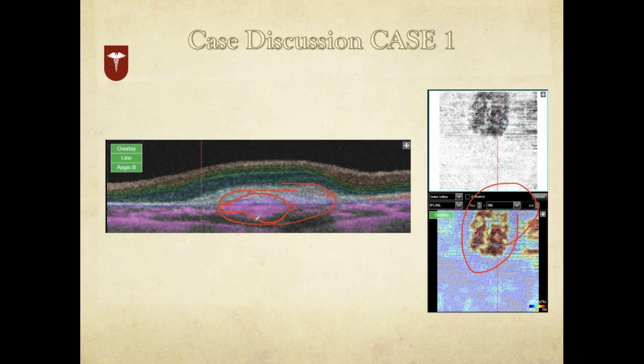In this space, what you can see is, although this is the layer which divides the retina and the choroid, the pink is the choroidal blood flow. The signals of choroidal blood flow are even appearing in the macular area, in the retinal area.